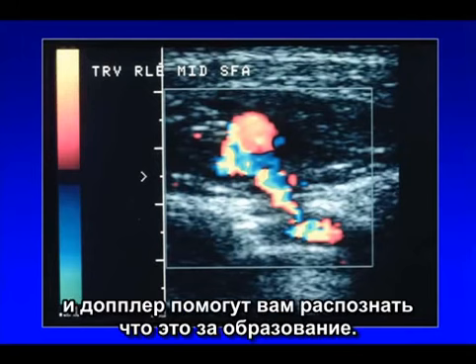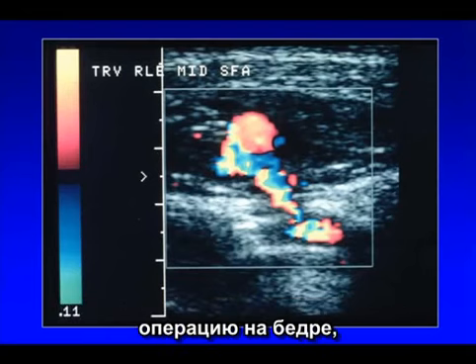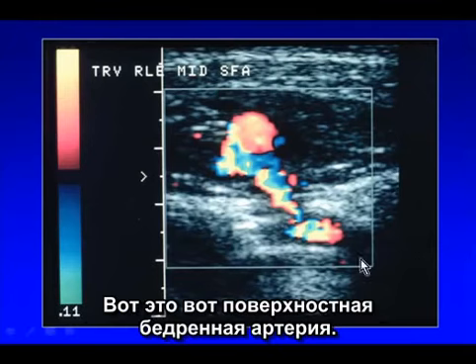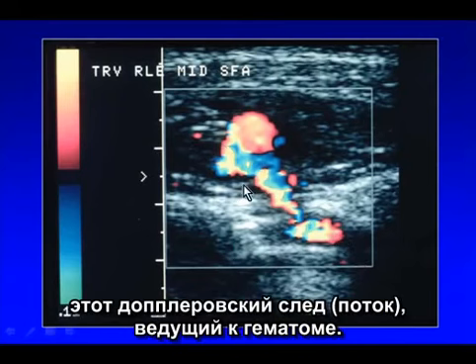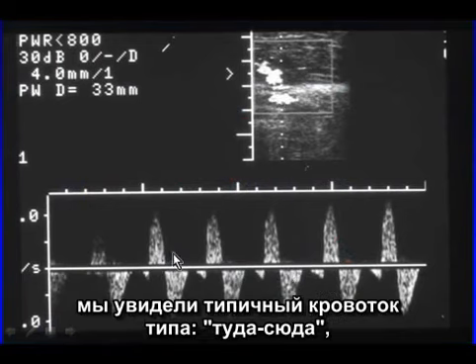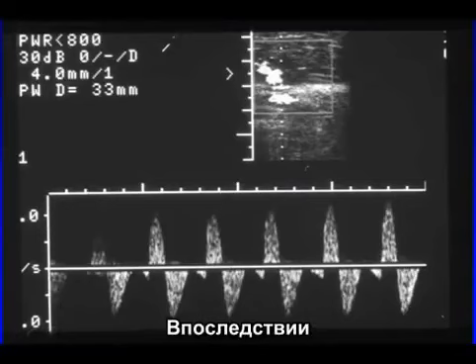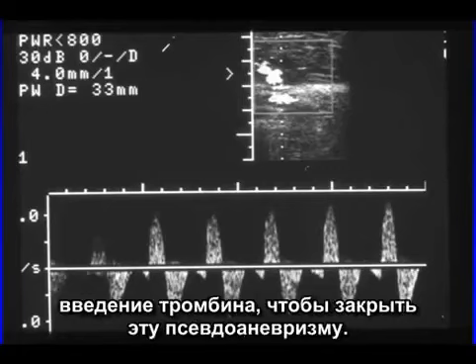Again, location and Doppler help you figure out what this lesion is. This is a patient who sustained a gunshot wound to the groin and presented with a palpable mass, which was pulsatile. This is the superficial femoral artery, and leading from the artery is this Doppler tract that leads into a hematoma. When we image the neck of this tract, we see the typical to-and-fro waveform that is characteristic of the neck of a pseudoaneurysm. So this subsequently went on to ultrasound-guided percutaneous thrombin therapy to close this pseudoaneurysm.